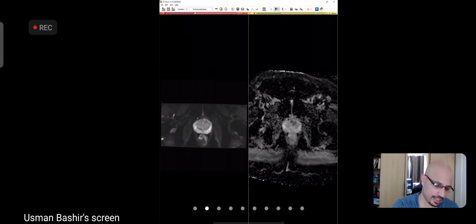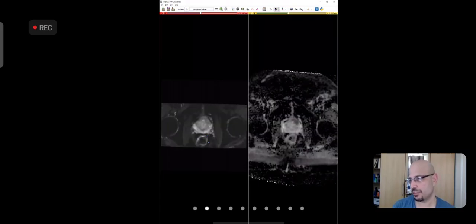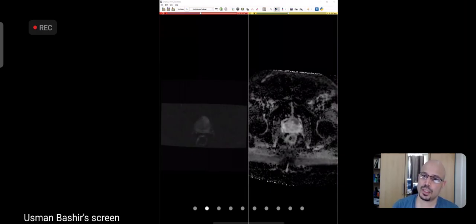B0 probably use होती है, but it's nothing different from a fat suppressed T2-weighted image. This one, I'm not sure if it's B0 or B50, but it's a low B value. और मैं quickly scroll up करता हूँ. This is highest. You see how as I increase the gradient strength in diffusion weighted imaging, that's the highest B value. There is an overall loss in signal.